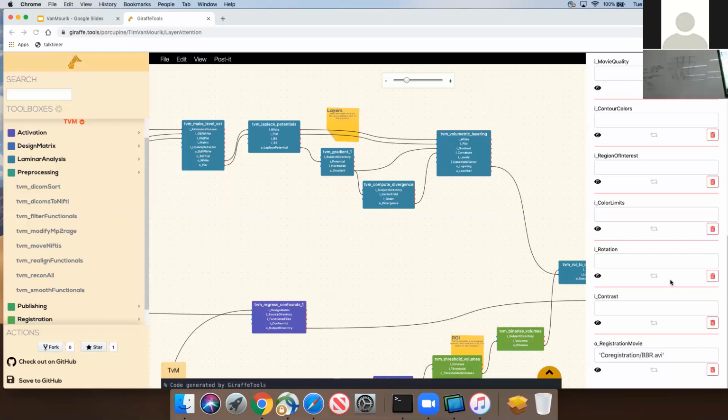Perfect. So we could say, well, let's now grab this one voxel here and say, well, which of the layers are represented in that voxel? Well, there is a tiny little bit of this one. Let me grab a different color for that one.